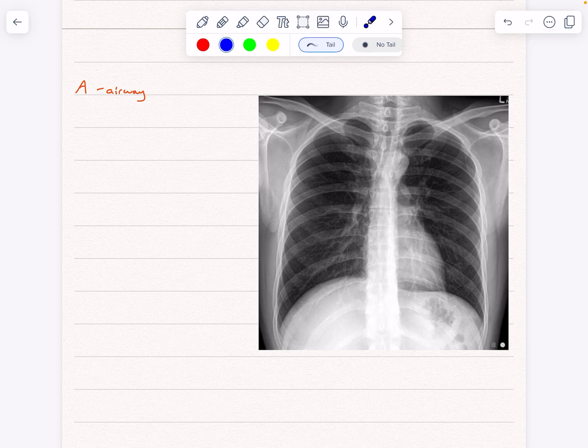The next thing we need to follow along on the respiratory tract, after the trachea to the carina to the bronchi, is the hilar regions, which are over here and here. This is just the vasculature of the lungs, and we're having a look at whether it's enlarged or not. If there's some kind of unilateral enlargement, this could indicate something like TB or any kind of malignancy. If there's bilateral hilar enlargement, this could indicate sarcoidosis.